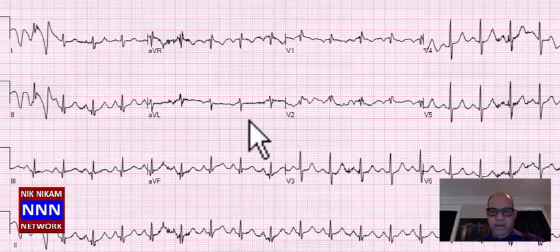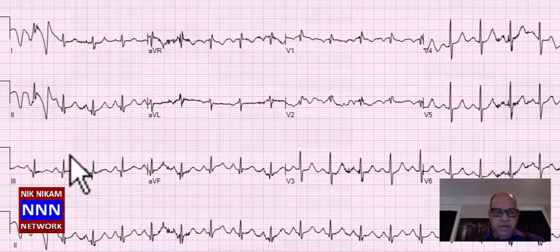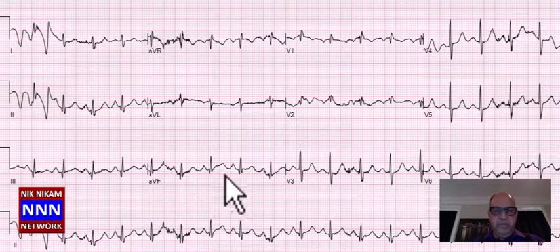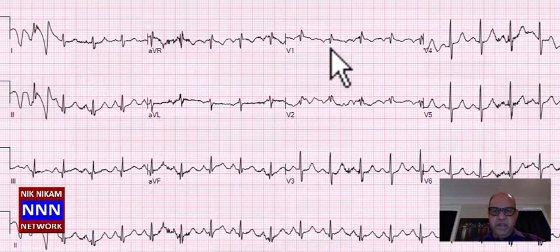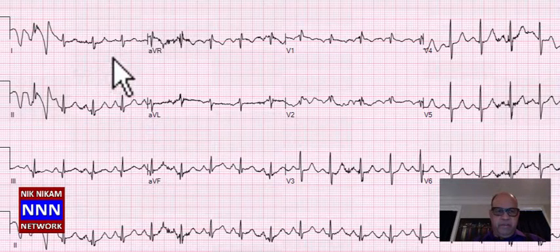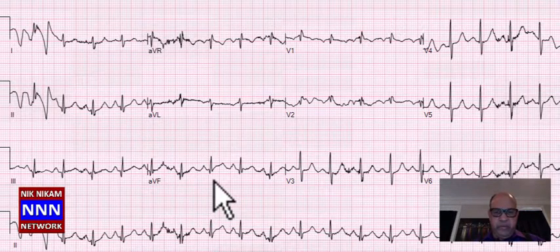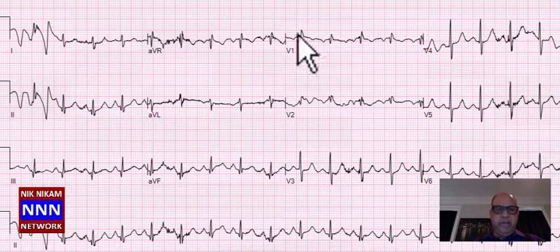Okay, here we have what appears to be a varying RR interval. But here we see good P waves. That's why I said you need to look for P waves in multiple leads to make sure that you're dealing with either sinus rhythm or atrial fibrillation. So this is sinus rhythm, and we have an RSR prime, so we have an incomplete right bundle branch block. For it to be called a complete right bundle branch block, it has to have at least 0.12 seconds, otherwise 3 boxes. So we have a sinus tachycardia with right bundle branch block and perhaps non-diagnostic Q waves inferiorly. And those are some of the main findings we see here.